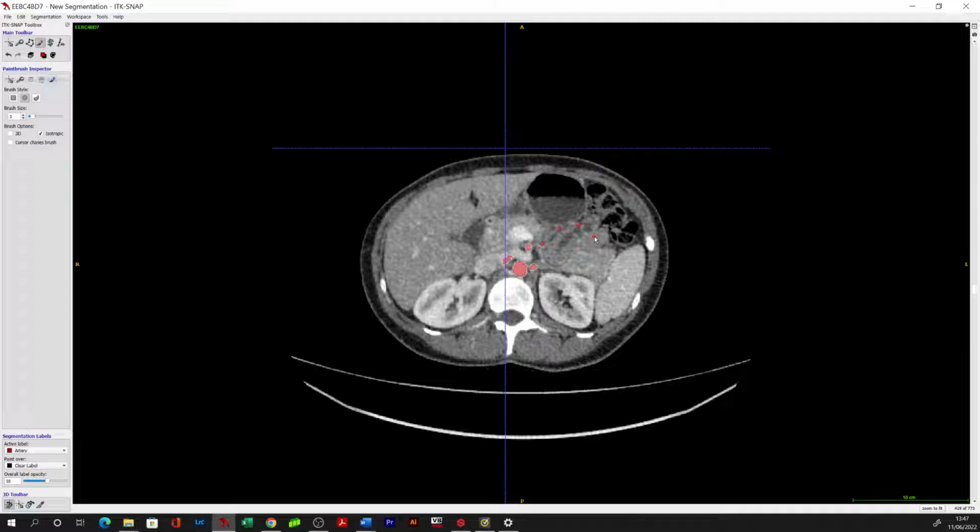If you've got a paucity of intra-abdominal fat, the vessels are kind of stacked on top of each other. Intra-abdominal fat enhances differently. So you can see here that it's this nice dark grey colour, which can really help in differentiating from, say, pancreas and duodenum, along with the intra-abdominal mesenteric vessels. So in that situation, it can make the interpretation difficult.